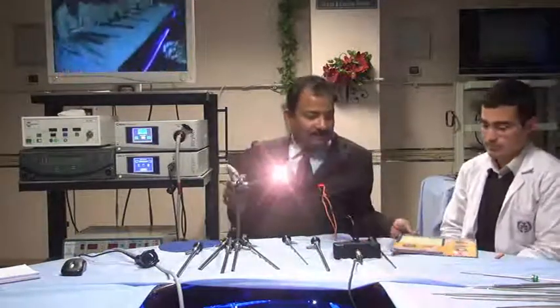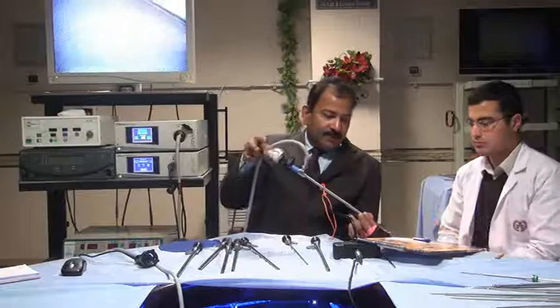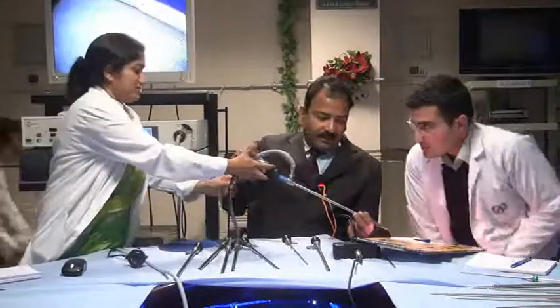I will show you. See here. Suppose this is a cardboard. Can you help me to hold it here? Just support it. Very good. Thank you.